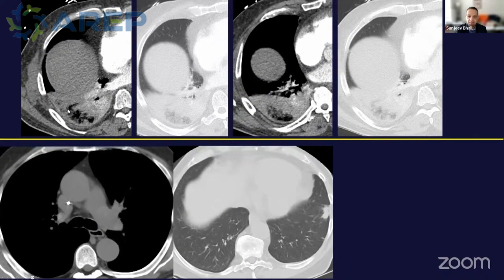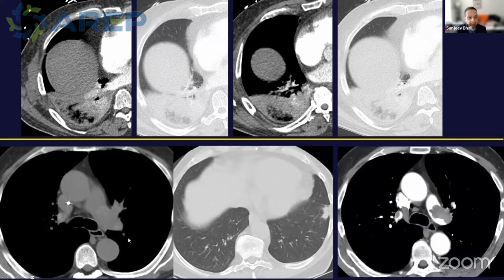Another example of a patient with an infarct here, where you could see that it did not enhance this thick wall below the yellow line. Here is a patient who came in for colon cancer staging, and our original thought was that we may be dealing with a metastasis in the left lower lobe. You can see this area here. But again, it's peripheral and it's somewhat irregular. And those of you, and I know there are many of you who are watching who've got very good eyes, notice that there's something irregular about the pulmonary artery in the non-contrast study. The patient was brought back, and in fact, it was not a metastasis. It was a patient with acute pulmonary embolism.